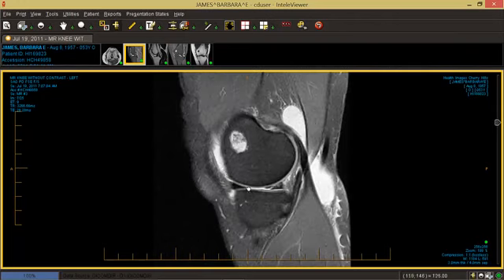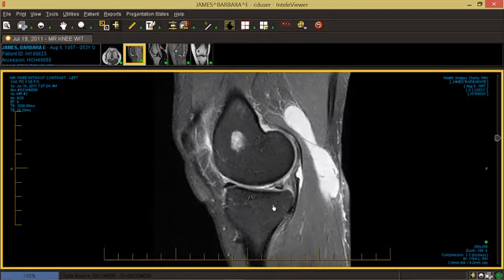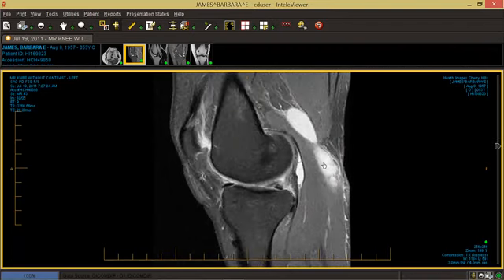We also see the meniscus. These triangles are the meniscus. This is the back meniscus. This is the front meniscus on the inside. And again, you can see this light color in the meniscus, which indicates that there's a bit of a tear. And as we go towards the very middle, you're going to see more fluid in the back. This would be defined as a Baker's cyst.